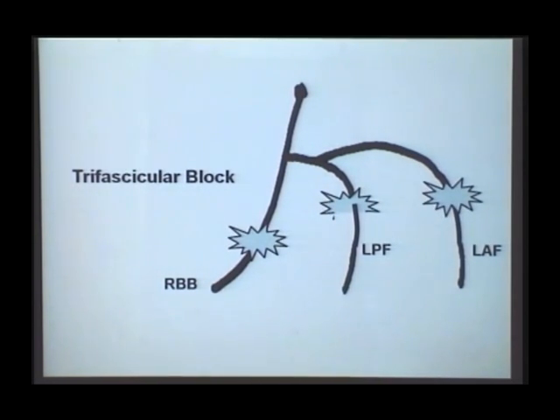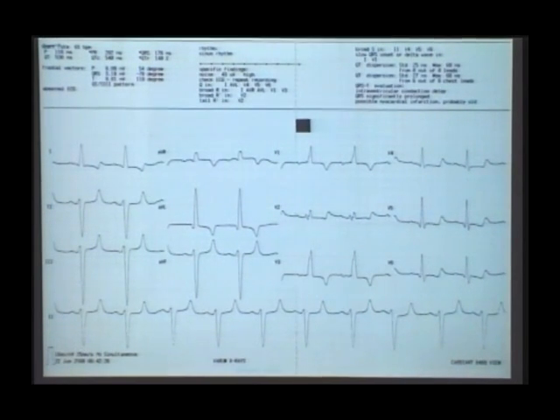So either a prolonged PR interval or other evidence of atrioventricular block, such as intermittent blockade of the P waves, you must suspect the third, posterior fascicle is partially blocked, and the patient is likely to go into a complete heart block and needs a pacemaker at this point in time itself. So this is your trifascicular concept.